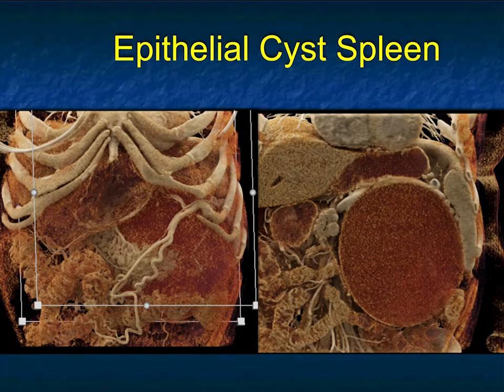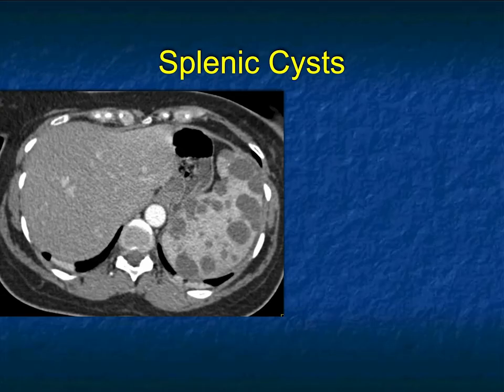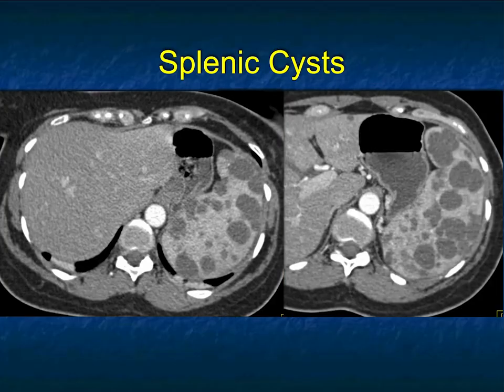You could also see in this case how exophytic it can be and why it can be somewhat challenging in reaching the right diagnosis. Splenic cysts can be multiple, as in this case. And again, you look at this, what else could you think about? Sarcoid, but they're a little bit lower density. Abscesses, but the patient would be febrile. And abscesses, this many, you would have to be immunosuppressed. And then usually they're smaller and hard to show fine margins.